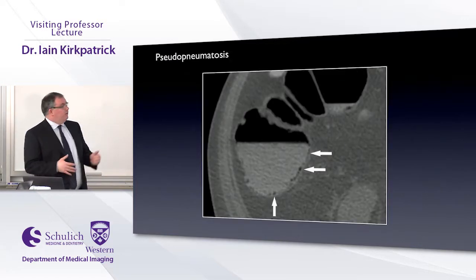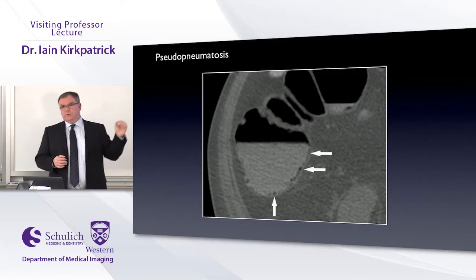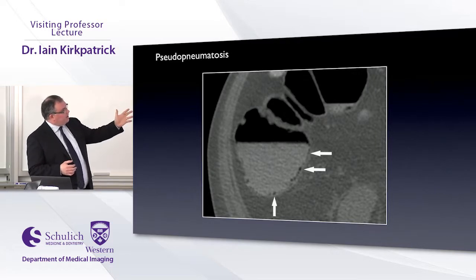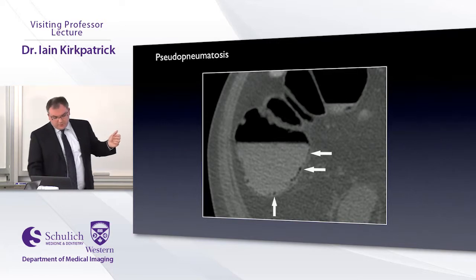There is the phenomenon of pseudopneumatosis. That's where little bubbles of gas get trapped between liquid stool and the bowel wall. It's not really in the wall, and the hallmark finding here is that the little bubbles don't go above the stool fluid level, or the stool air level.